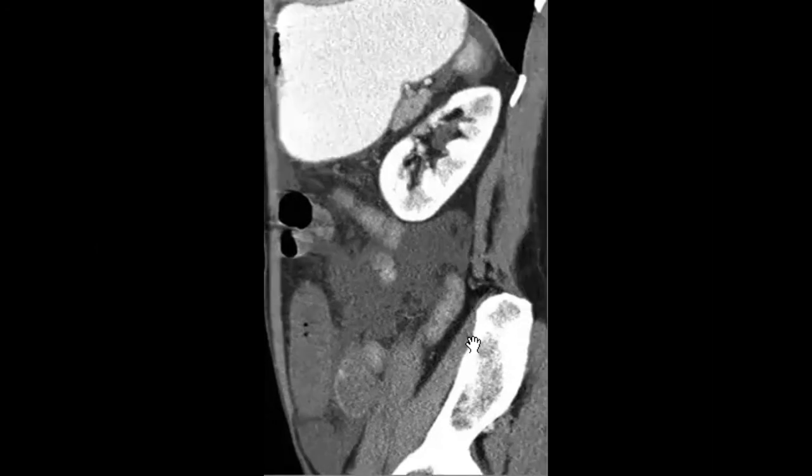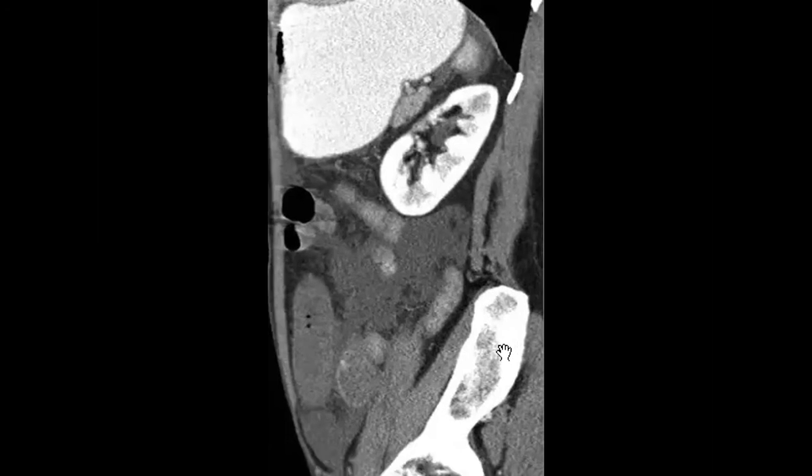No ascites, you should comment. For this case, ascites was positive, and the gas in this case was negative, but it is an important negative that you should comment on. And finally, the portal venous gas. If there is any portal venous gas, be sure that it indicates a very bad sign, and if it is present, you should mention it. Okay, the engorgement and the thrombus formation, everything, reduced bowel enhancement, all these criteria we mentioned already.